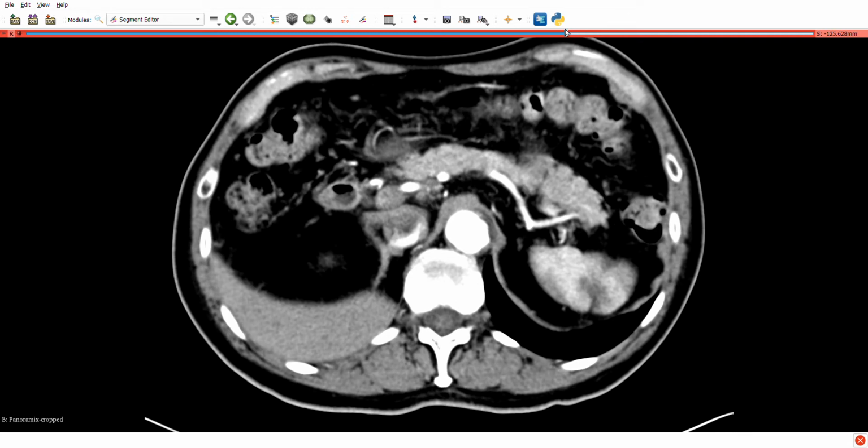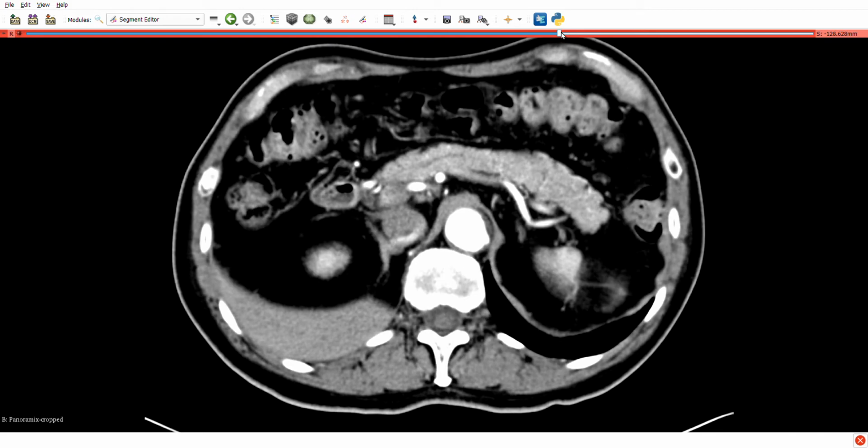And furthermore, that splenic artery, as it passes by the pancreas, sends off lots of pancreatic branches, which are actually quite small in this case, feeding the pancreas with a rich blood supply. So we've seen the common hepatic artery and the splenic artery.